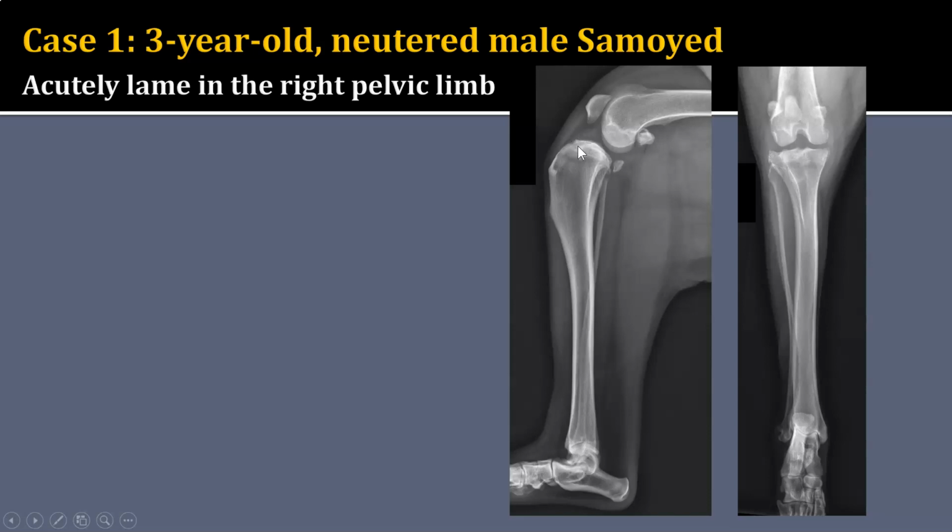And so this is that term enthesopathy. So bone that's forming at origins, insertions of ligaments, tendons, and joint capsules. And then it's also surrounded by some subchondral sclerosis. The remainder of the bones, I think, are normal in this patient. Notice this little mineral opacity, that is a normal sesamoid. That's our popliteal sesamoid. I can see it more clearly because it really has not moved in its position when the tibia moved. So it's actually a little bit displaced from the tibia now.